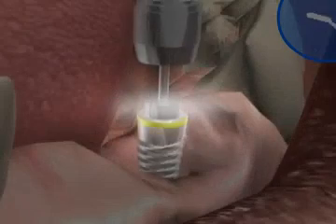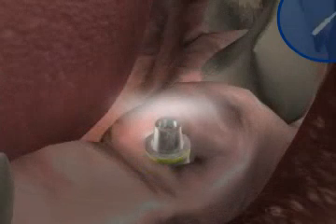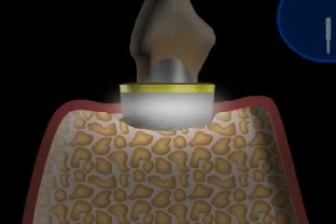Immediate bone reduction after denture insertion has been observed for a long time with various implant types. This caused the upper implant parts to stick out of the gums frequently, a very bad sign from a medical perspective. In the X-ray, you can clearly identify the bowl-shaped bone reduction.